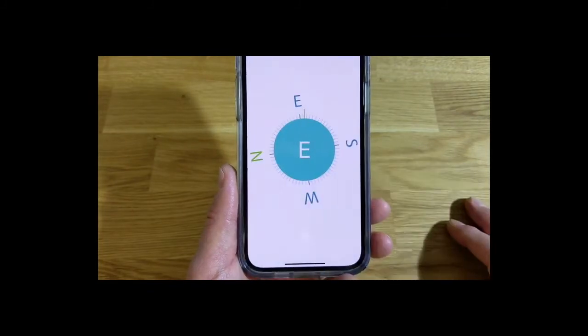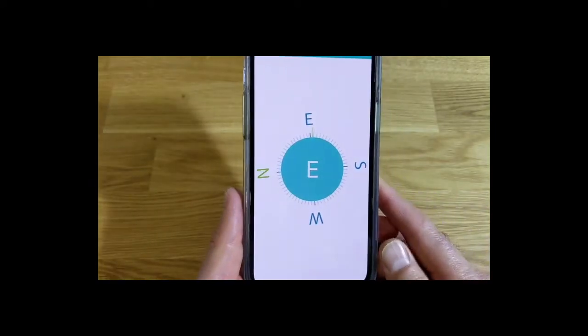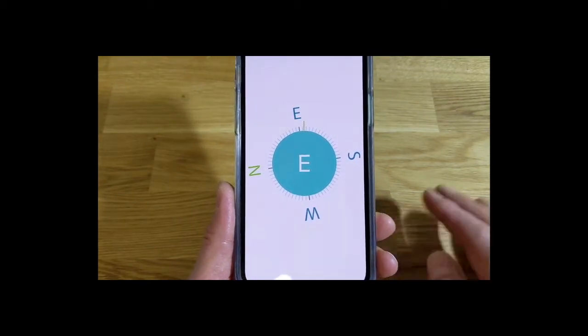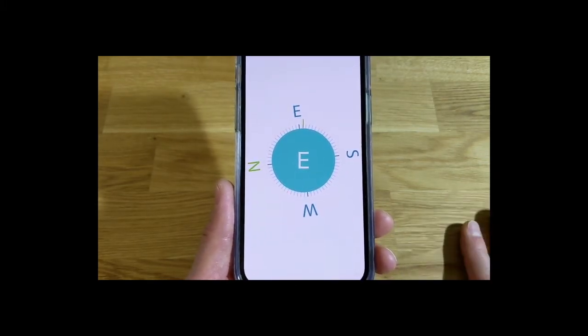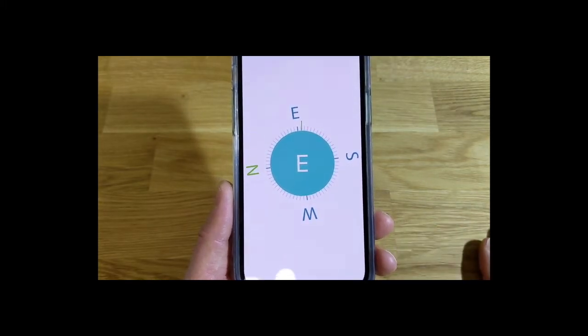The compass. East. Southeast. Turn the compass. East. It updates, Northeast, to that particular east direction. This is a very easy to read compass with large characters, and the spoken prompt is much easier to use for many individuals than the built-in compass on the iPhone because of the complexity with latitude and longitude and degrees of the compass that are provided in the iPhone compass.